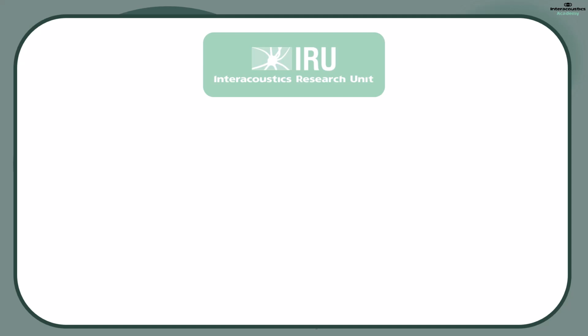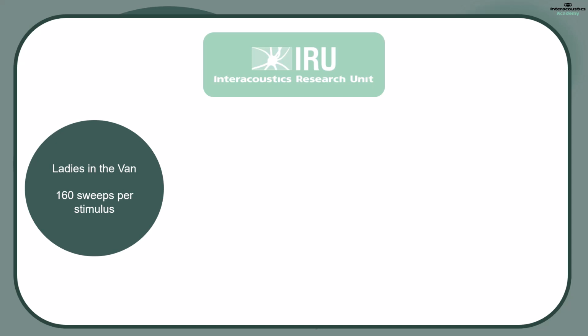The residual noise value of a waveform can be used to inform when to stop testing, when it looks likely that no response is present and going to be recordable. The Interacoustics Research Unit has explored the data sets available to understand the residual noise values in aided cortical responses in more detail. A good starting point was the Ladies in the Van study. In this study, 160 sweeps were tested per stimulus.